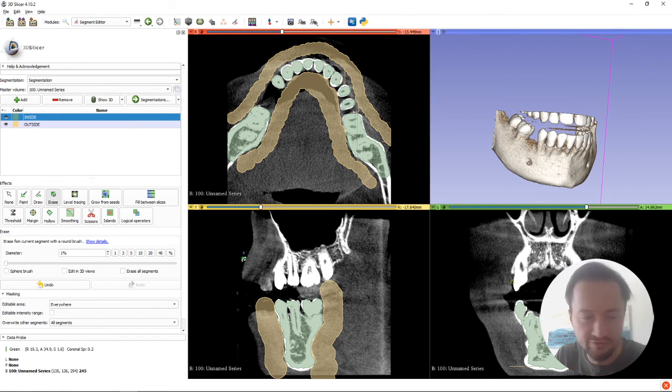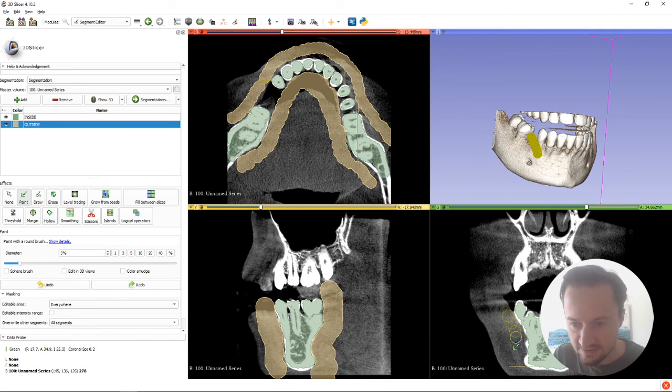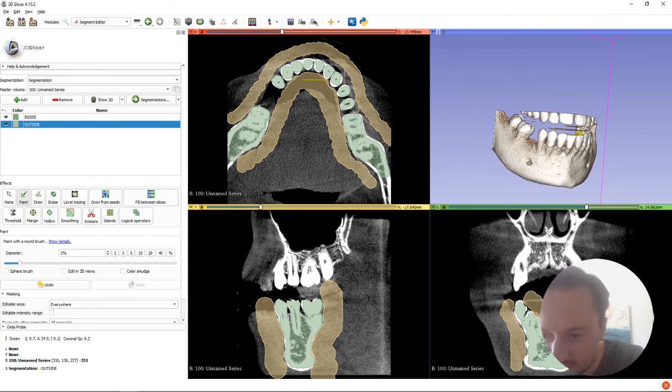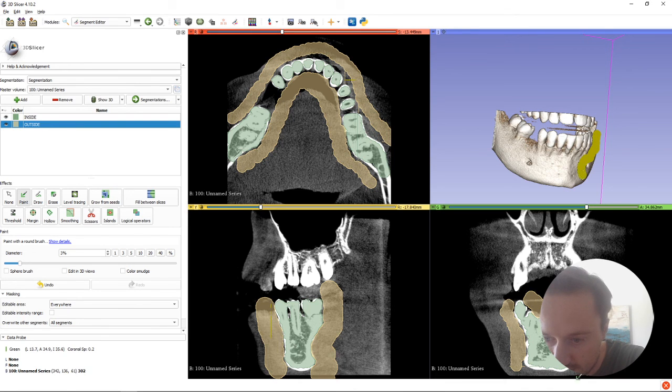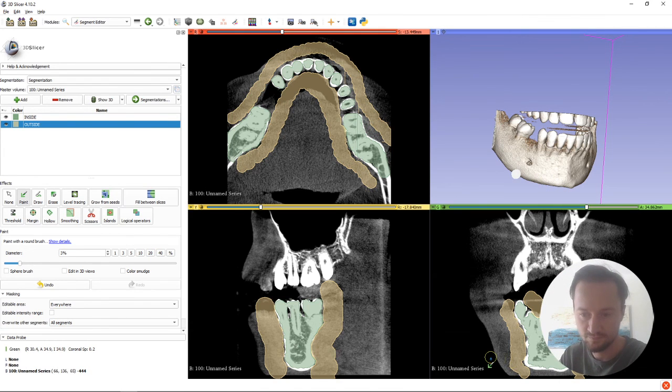Because where we can, we want to avoid the extra noise that's going to come through. I've clicked paint outside, increased it again, and same as before, let's just define a little bit of that outside. Now I'm going to try to get a little bit closer here, just because some of that grey will interrupt for the noise as well. So let's try. Right, okay, that looks pretty good.